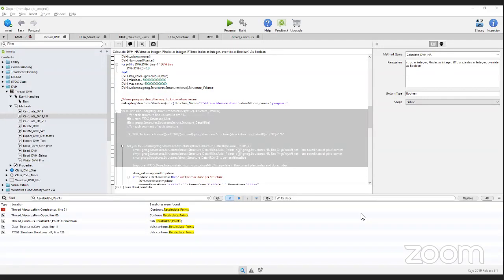Well, I think every company like Pinnacle or Accuray or Eclipse, they'll all have different methods on how to do that calculation. And the method that I'm displaying might be the absolute slowest method of doing it, because it's not using a mesh, which I believe most companies try and create, which can have various degrees of resolution to try and speed up the calculation.